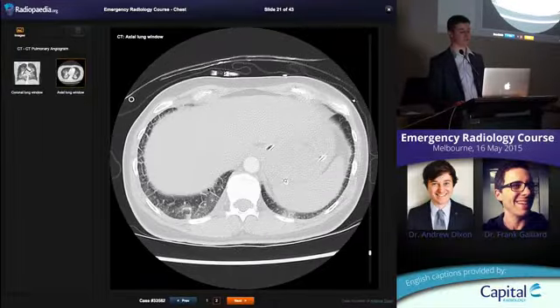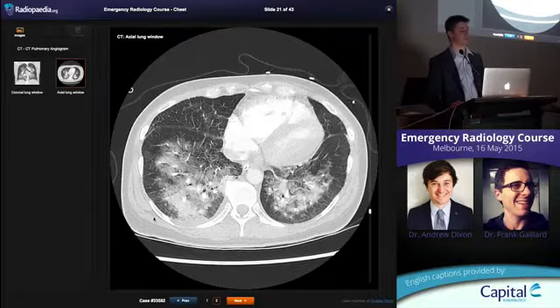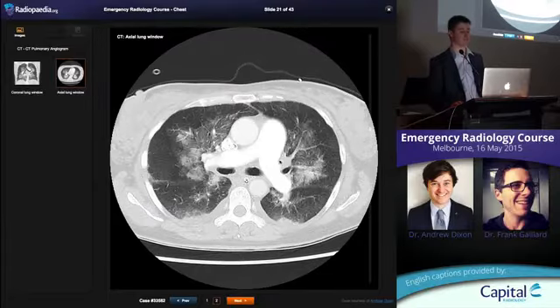So all these things, not vessels. Vessels don't go out and touch the pleura. As we saw earlier, we knew the pleura was there because there were no vessels. These things are all interstitium filled up with fluid in a patient with acute pulmonary edema. And just to look at that, the pulmonary artery is massive here, much, much bigger than the aorta. That's pulmonary hypertension.